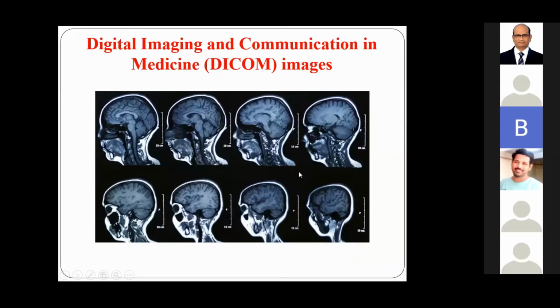After extracting the images, we are getting these images. After extracting the bony information, we are taking it as DICOM images. DICOM full form is Digital Imaging and Communication in Medicine. Using these DICOM images, the doctors detect the problem and identify the defect. They are going to do the surgical procedure based on these images. But to make medical models, to make an implant, we require all the images. You have to take all the images and merge them. Then we can develop a CAD model.